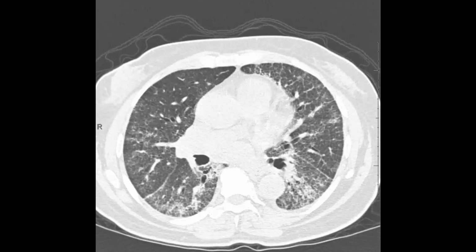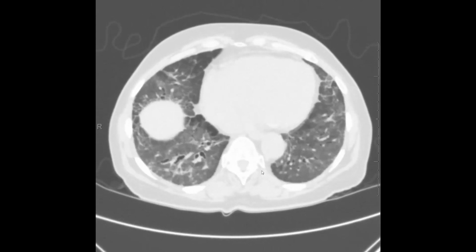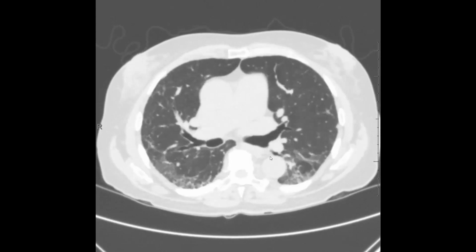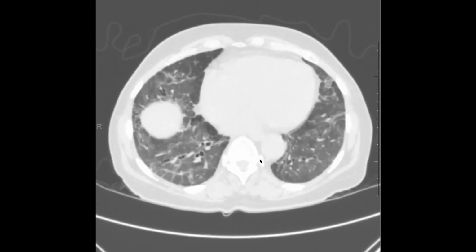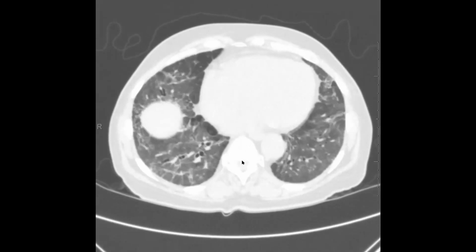Over time, again, I think in addition to the initial CT pattern, looking at the evolution of disease is important. So this patient, let's show you a CT from 5 years later. In this patient, the consolidation is markedly improved. Now there's residual ground glass opacity and reticulation within the lung parenchyma, again, basal predominant. And there is increased coarsening of the pulmonary findings. And some might even question some early subpleural honeycombing within the lung periphery.